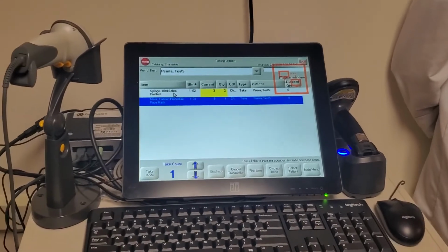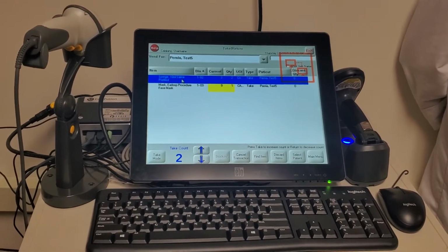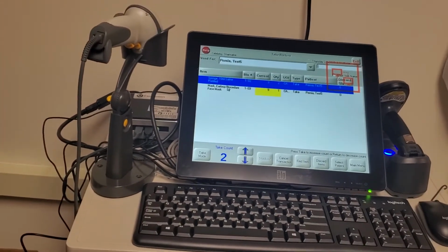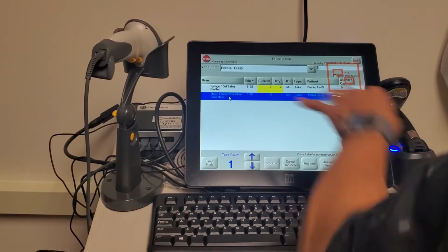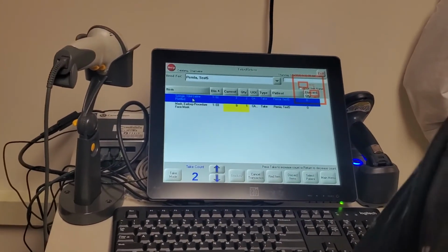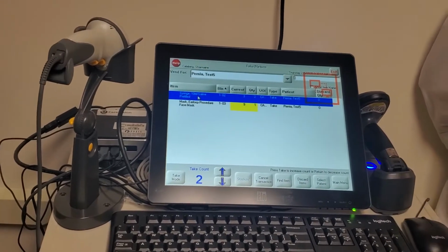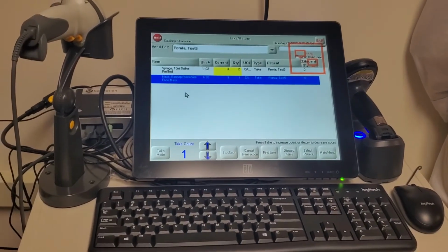But we're going to buy you a basket, and then you can do your shopping here, and then you can put your basket right here. You scan your MRN or whatever, and then click. Carry out your basket? Yes. So shopping cart? We're going to put it right here, as long as you return it. They have their own wheels? I know, right? That's nice.